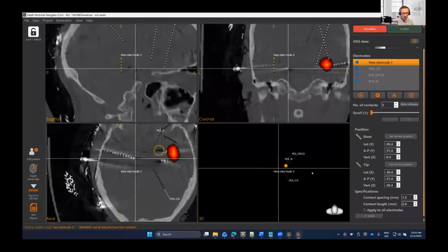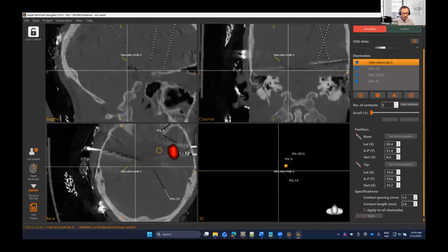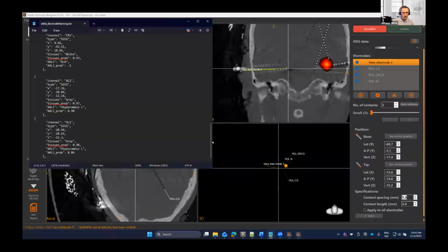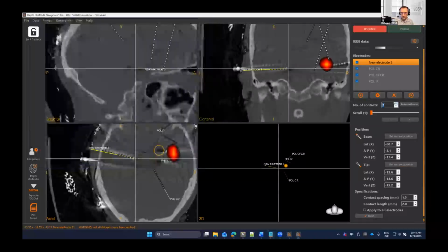I have a contact and I will just set the base of it. And now just go a bit up. So I found the stick, set the base, set the number, set the distance, and AL has 12 contacts. Easier like this, just rename it to AL.